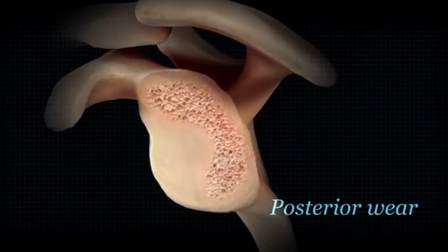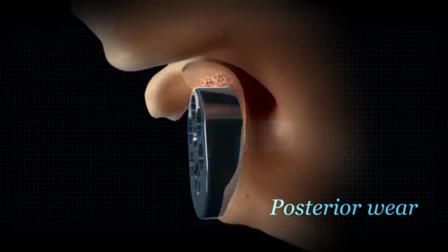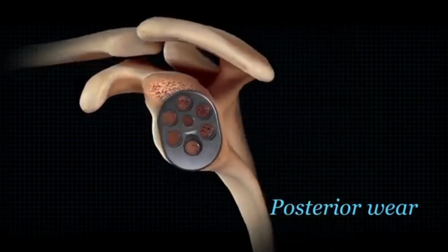When using reverse shoulders in posteriorly worn glenoids, the joint line should be lateralized with posterior augmented implants.